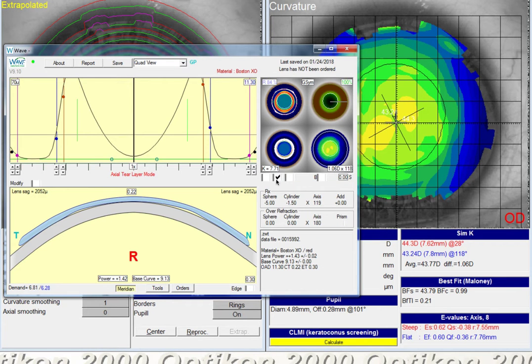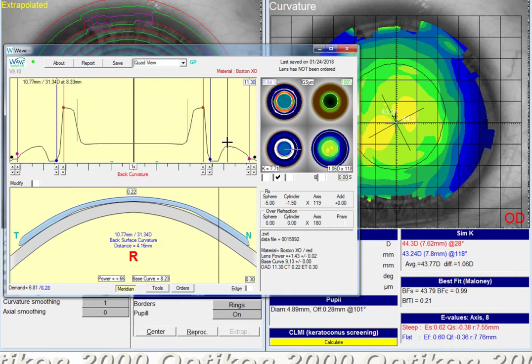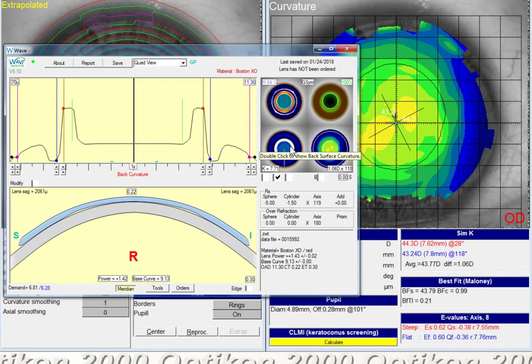I'd recommend starting with GSIM first. I don't think there's any need to start with freeform. And I didn't set everything exactly to your old parameters, but I think those were fine. You can use the settings that you had for the first lens, but this one will have a much more even back surface curvature. We're actually a little bit steeper now in the horizontal, but the vertical is pretty similar to it. So much more even around for a fairly even cornea. And I think that makes a little bit more sense. So best of luck with your patient.